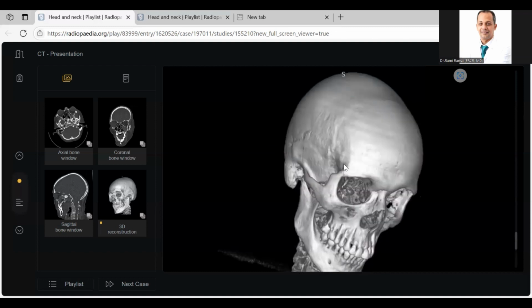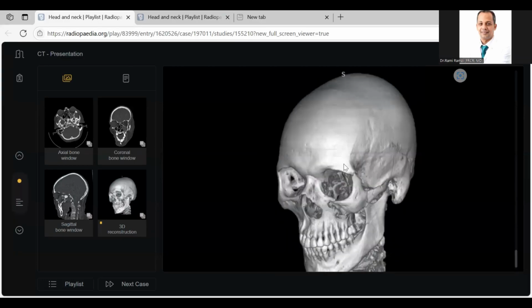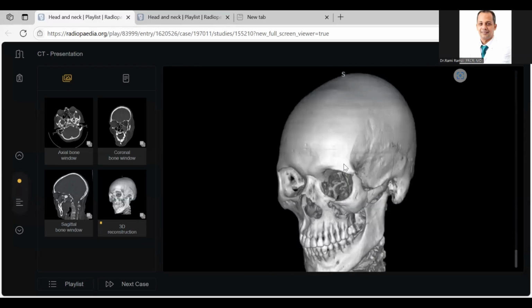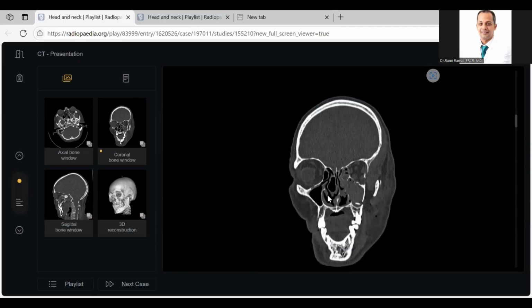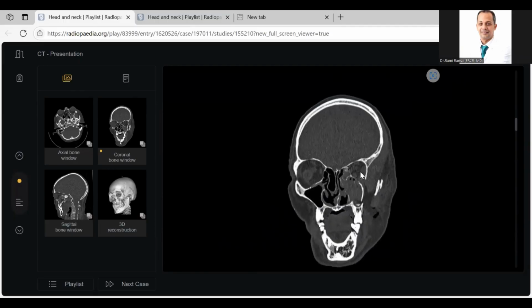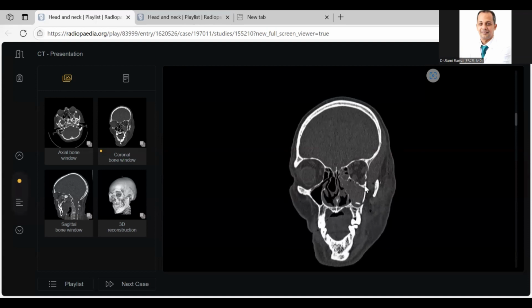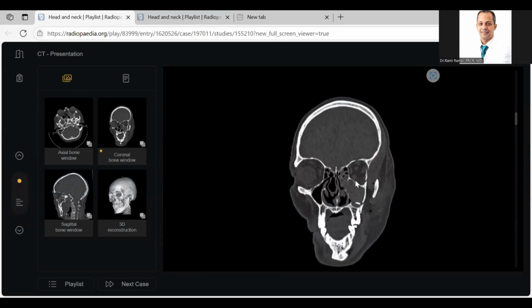Really, you are amazing. Thank you. This is a tripod fracture. It may come in short, because it is a short case. But why did I bring it? Because it is a surgical emergency in some cases. Why? Due to herniation of orbital content, especially. See, excellent, there is some herniation here. I think this is maybe fat rather than muscle, or part of muscle, because I could detect the inferior rectus muscle. Anyway, it is not life saving.